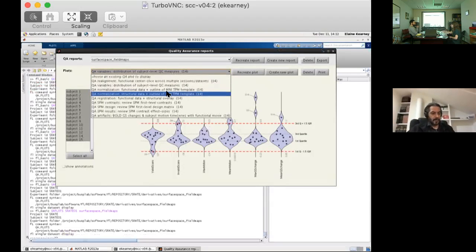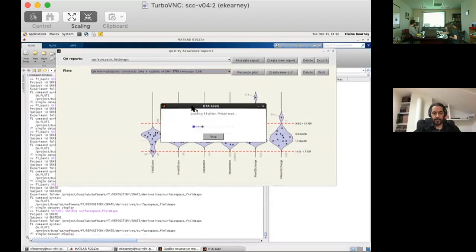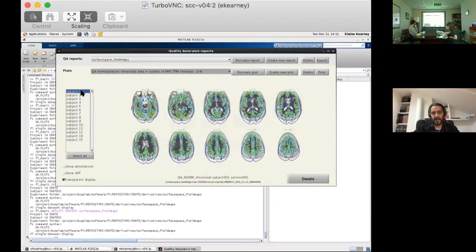One thing, just looking through these, the structural data plot has the FreeSurfer... Right. So the structural data, when the FreeSurfer data has been extracted, these plots are going to show you now these FreeSurfer-generated borders, and that appears both in the structural plot and in the surface plot. Even though the actual surfaces have been generated by FreeSurfer only from the structural data, they are showing you those borders in both plots.